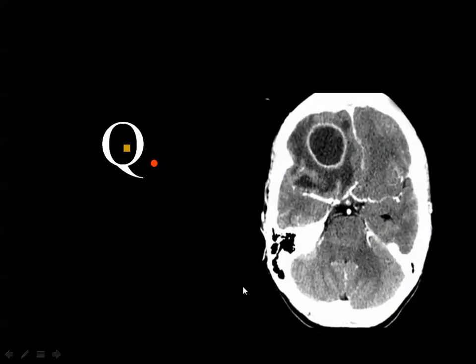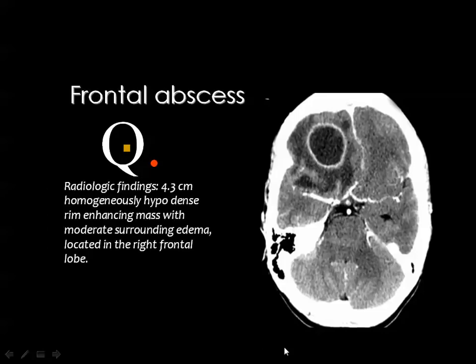Axial CT scan of the brain, soft tissue window, after injection of contrast material. The lesion? Yes, there is an oval-shaped, marginally enhancing lesion in the right frontal lobe, surrounded by perifocal brain edema. The enhancing margin is of uniform thickness, suggestive of a brain abscess. Okay.